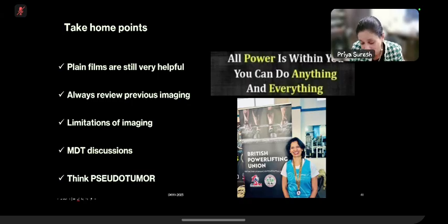The other case, only this Wednesday we had a case of subsidence, where you can see on serial radiographs that the prosthesis is going down slightly.